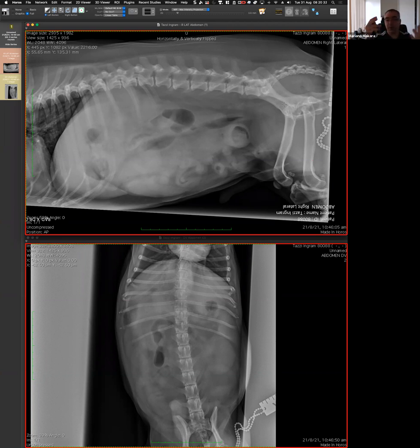Another thing that we could be thinking, and it would look like something in that area, would be a perineal hernia. But there we probably wouldn't expect to see the contour of the bladder that well. It could be that the prostate is going there and then it's here. I haven't mentioned, but the dog I think is not an entire dog. That doesn't mean that it's less likely to have prostatic neoplasia, but probably less likely to have a hernia. Okay, that's kind of my answer to that.